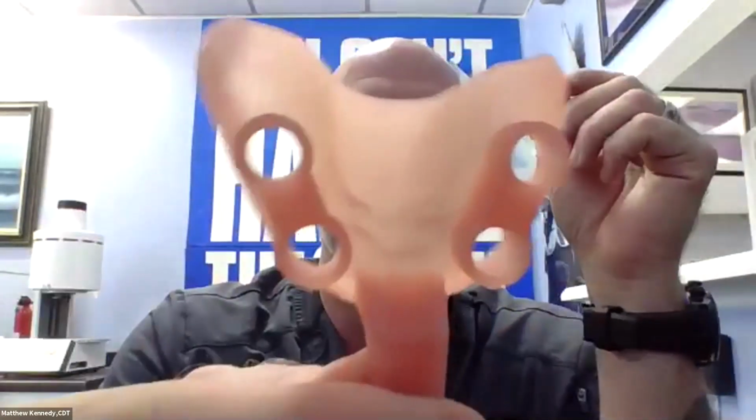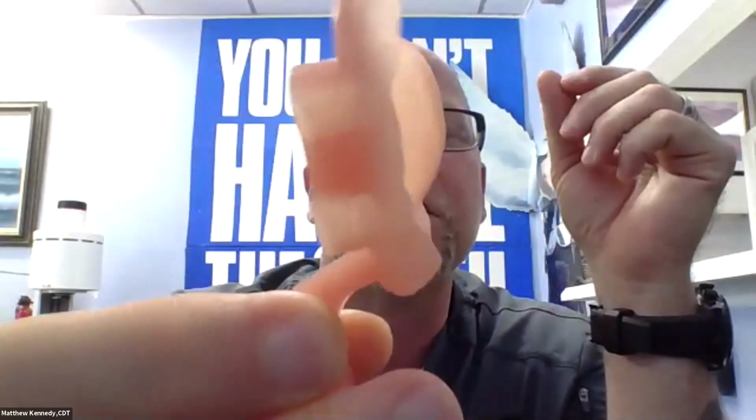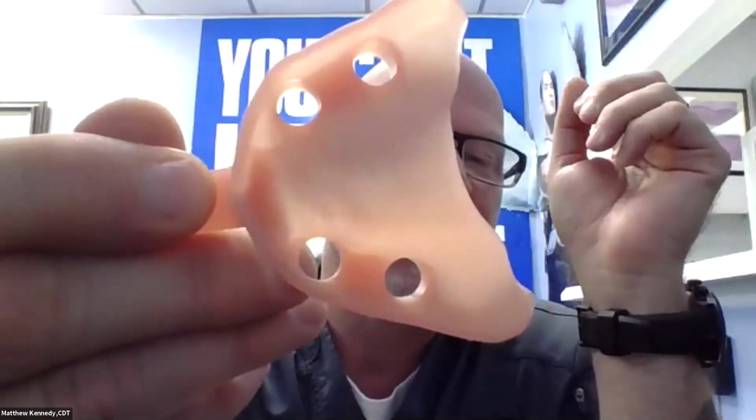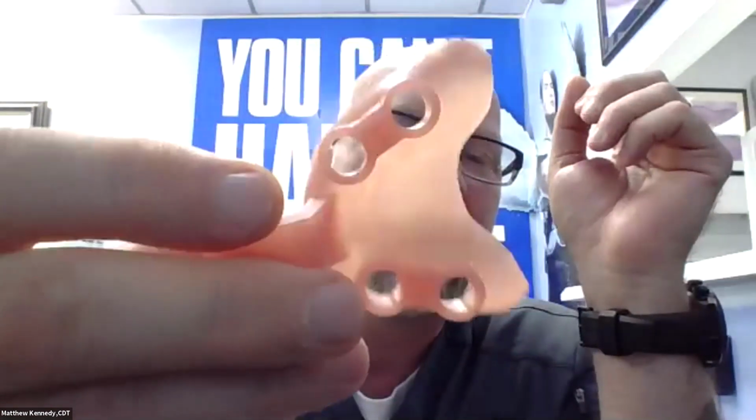What else we got over here? Custom trays. She has a custom tray material. When you're doing your All-on-Fours and making those cases, we always like to have a custom tray, because you never know what's going to happen, and you may have to take an impression, and you may not be able to use the denture for that. So we pretty much always produce a custom tray to take with us on conversions.